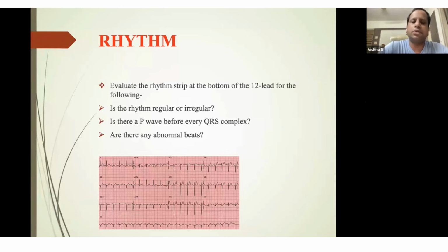അപ്പൊ അതിന് P wave usually we won't see. Heart rate will be faster. Then it can be ventricular tachycardia. അതിലും P wave നമുക്ക് കാണണമെന്നില്ല. P wave will be hidden in QRS. In between P wave കാണാം. So then in bradycardias and high grade AV block, relation between P and QRS will be altered.